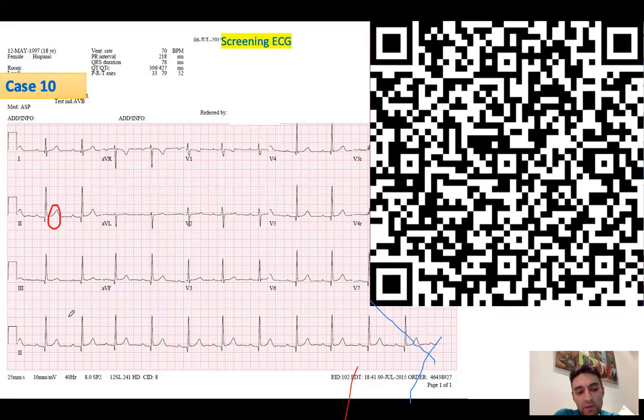If there is a P wave that's hidden, let's say somewhere here, then the sinus rate is like 150. An 18-year-old with a sinus rate of 150 doesn't make sense. So the age and 2-to-1 don't make sense in this case. Plus, the T waves are really clean, and I don't know why the confusion of 2-to-1 heart block.